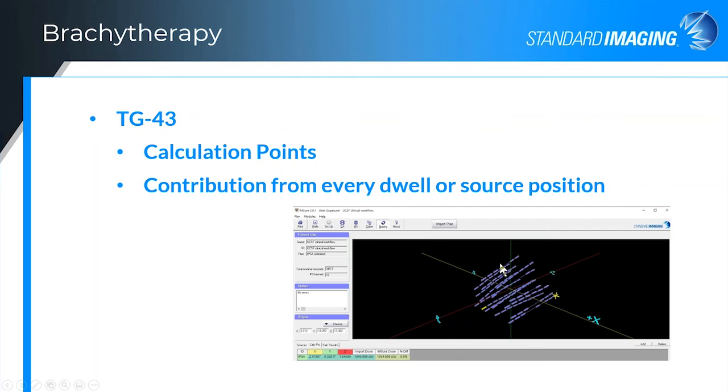And within IMSure, you can see the graphics for the positions of the different sources. And then down here at the bottom, you can see the composite dose for the imported plan versus the IMSure second check calculation and the difference between the two. And so this is for the point, which is highlighted in yellow for this particular plan.